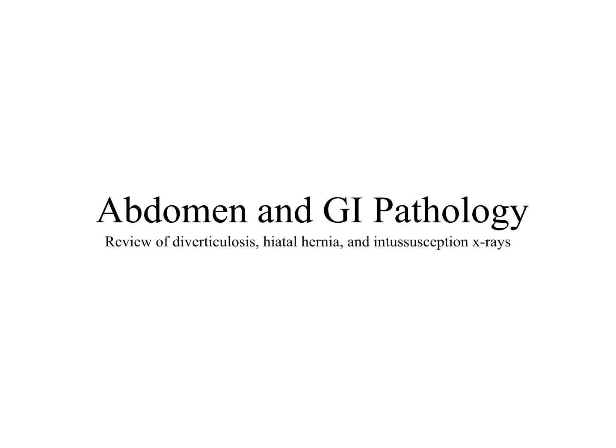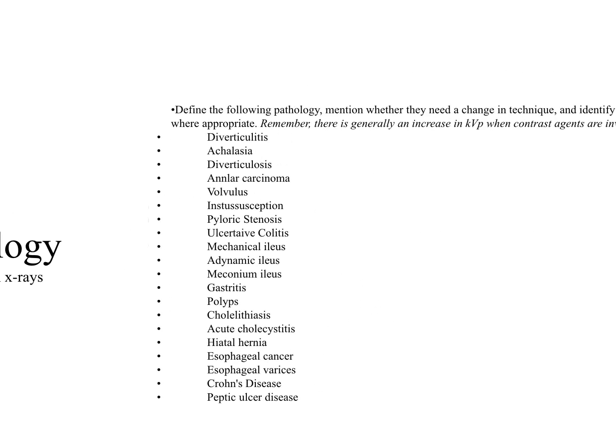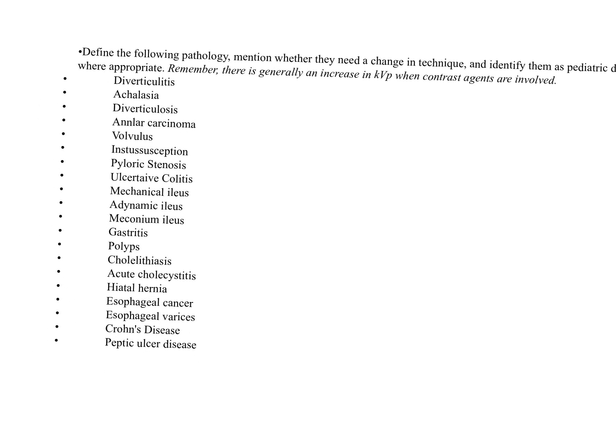All right, so let's briefly talk about some abdomen and GI pathologies, and we're going to spend most of this time reviewing some x-rays. So we have our list here. It can also be found in Canvas, and all of these are presented to you on the PowerPoint for this week. The big takeaway from this is going to be the ability to define the following pathology and mention whether or not they need a technique change.